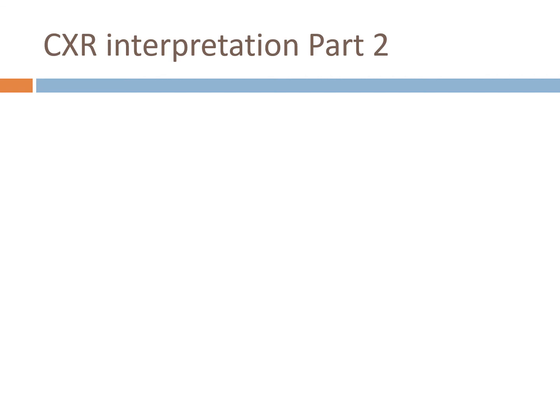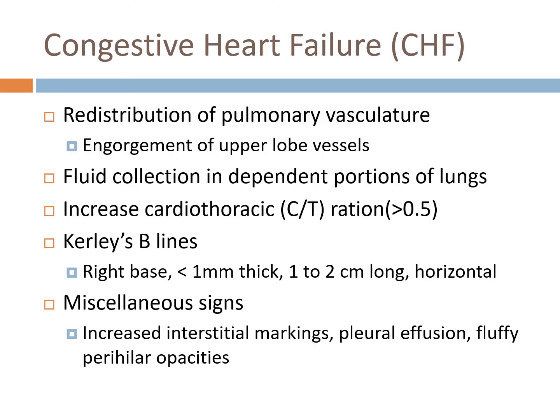Alright, so are you ready for part 2 of the X-ray interpretation? It's not just going to be X-rays. The second part, we're also going to be talking about MRIs, PET scans, CT scans, so just other imaging.